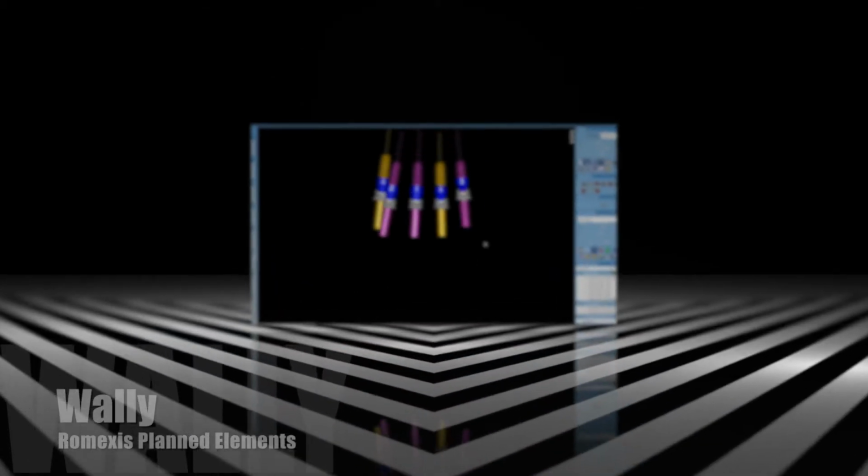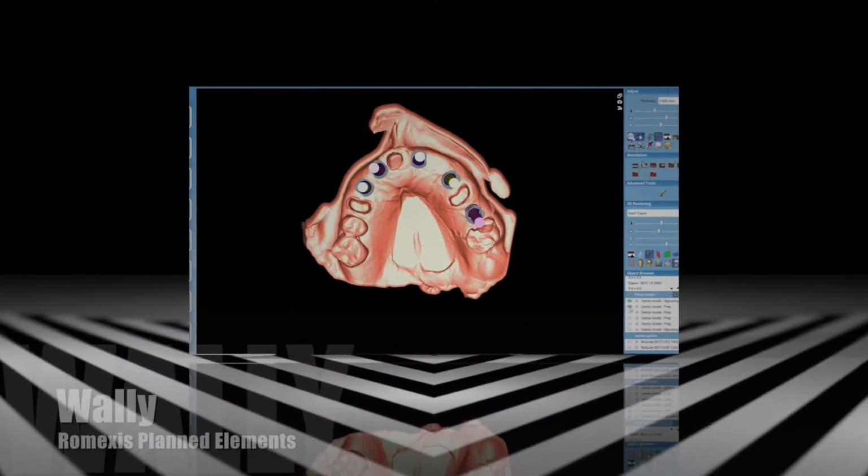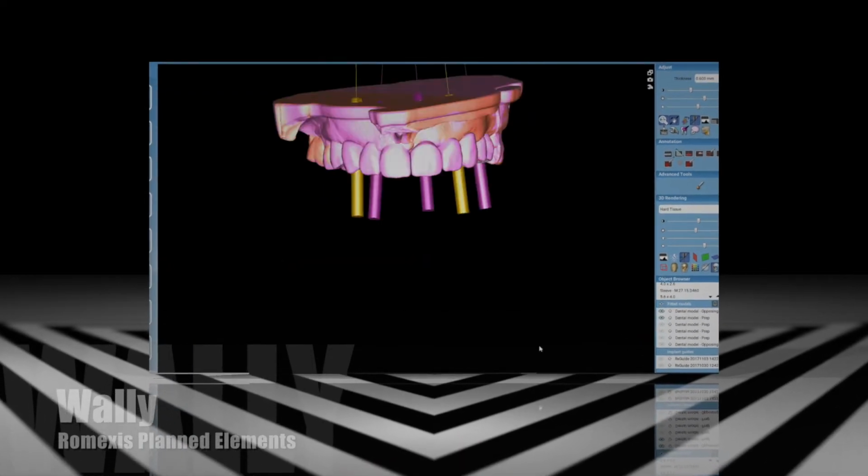All right, guys, a little teaser, something coming in Romexis. It is the ability to export all kinds of stuff. So let's take a look.